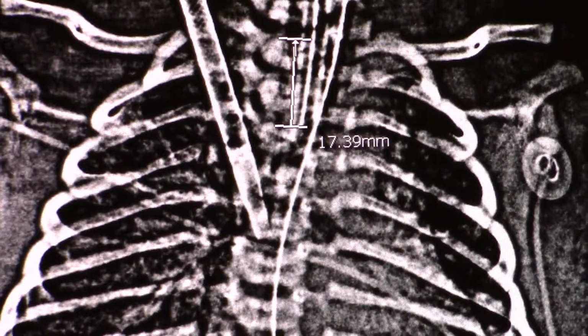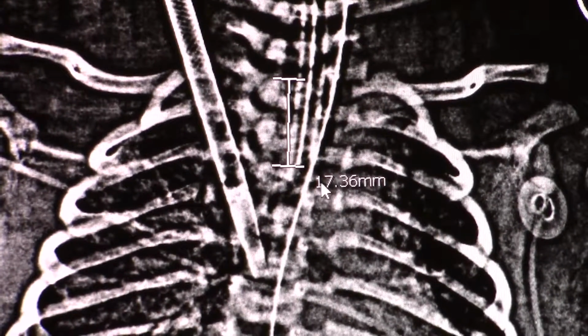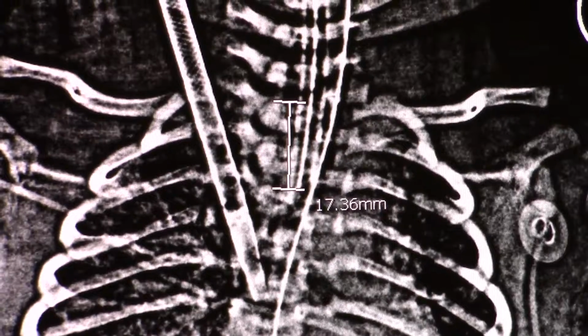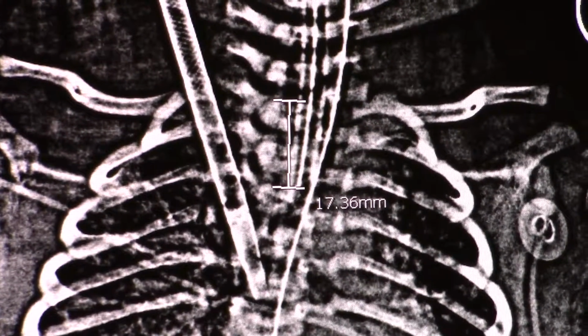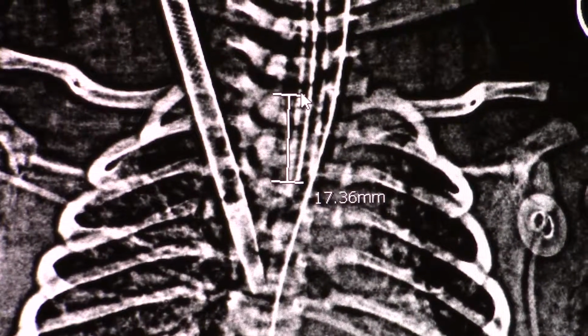How far is it until it's at the top of T1? It's going to show you in millimeters, so you move the decimal over. So this right here is 1.7 centimeters. That means the tube has 1.7 centimeters before it should be located at the top of T1, which everybody agrees is too high.